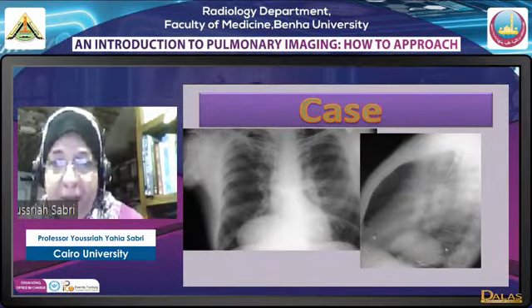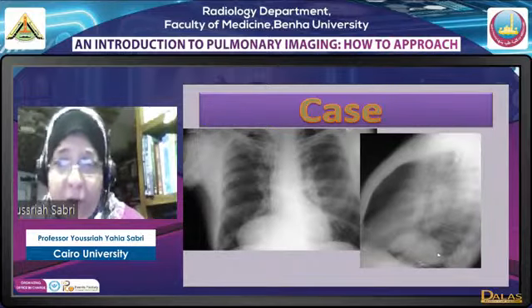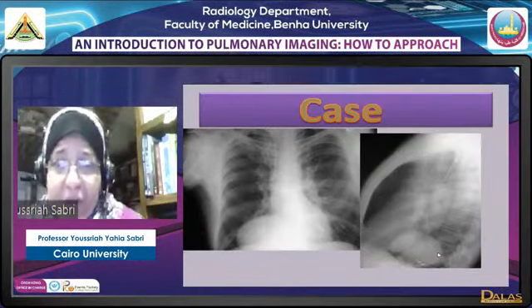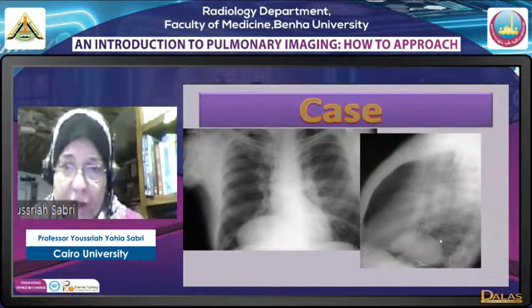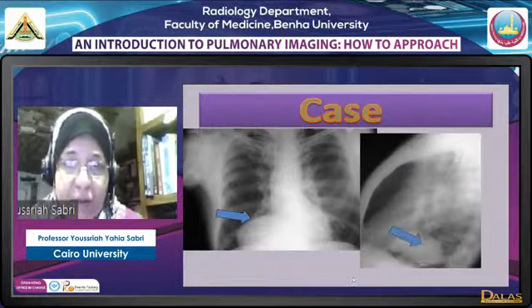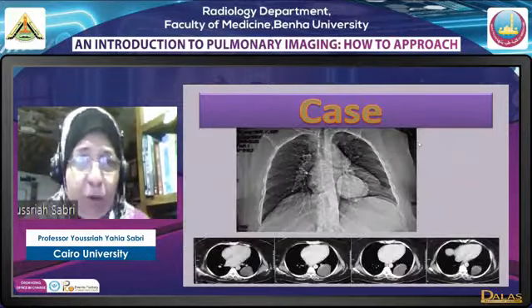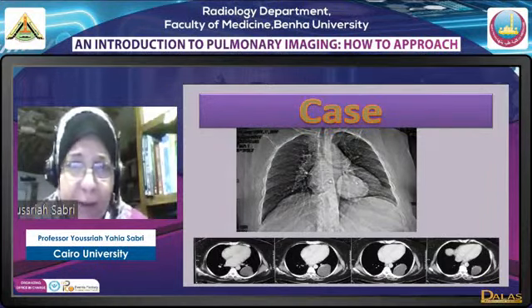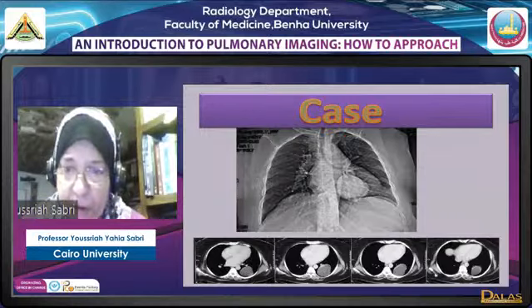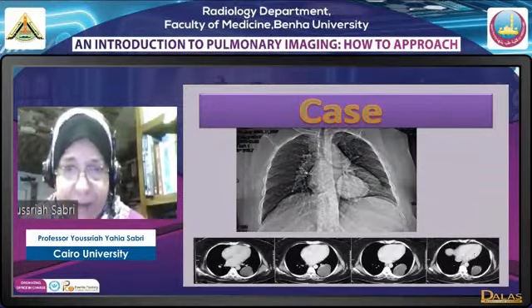اول ما بنشوف ليجن بهذا الحجم this is a benign looking، مش بس benign looking it raises the possibility I'm dealing with a cyst. I'm dealing with a fluid containing cyst. Smooth large lesion with outlining like this. This is the case, actually it was a case of solitary hydatid cyst. حالة تانية بتأكد هذا الكلام برضو female patient at 7th decade. هنا بصوا حضراتكم very well defined smooth large mass lesion. لما نبص على tissue characterization it's totally fluid content, again the case of hydatid.